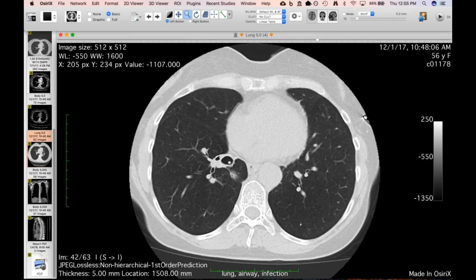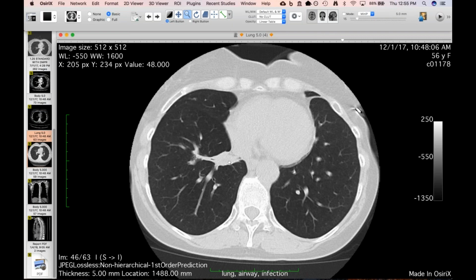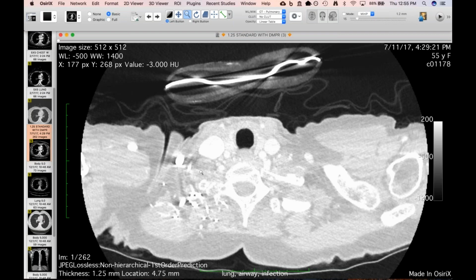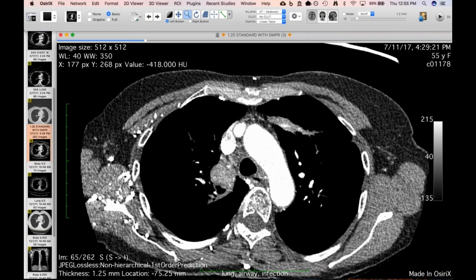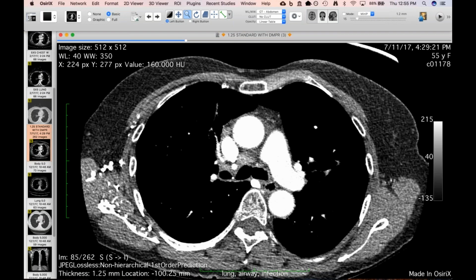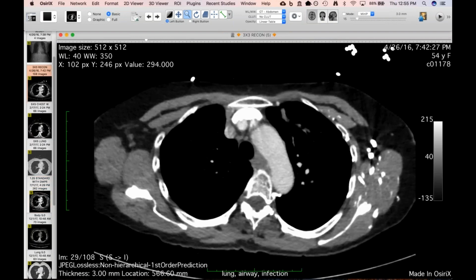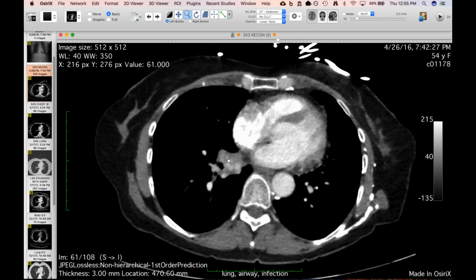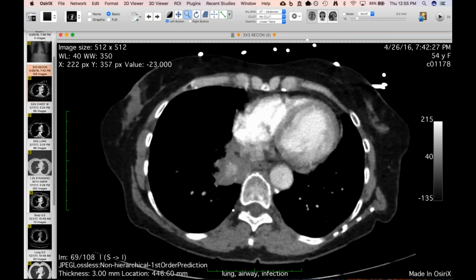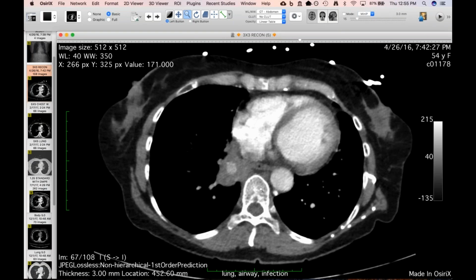So very, very impressive. It's a cool case. Yeah, I think it's a good example of the spectrum of allergic bronchopulmonary aspergillosis, and maybe the poorly understood bronchocentric granulomatosis that can mimic cancer. But I think the clue here, even on this first one, was the high attenuation mucus you see in these airways. We don't have a non-con, but you can clearly see they're big, high attenuation, iron and manganese salts and whatever else is in these areas of mucus.